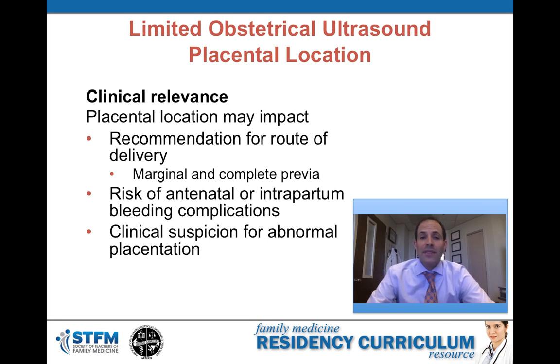It's important to have an idea of where the placenta is located because placental location may significantly impact a patient's clinical course. Placental location will impact their potential route of delivery. So, for example, in the case of a marginal or complete placenta previa, there is a chance that a patient may require a cesarean delivery.